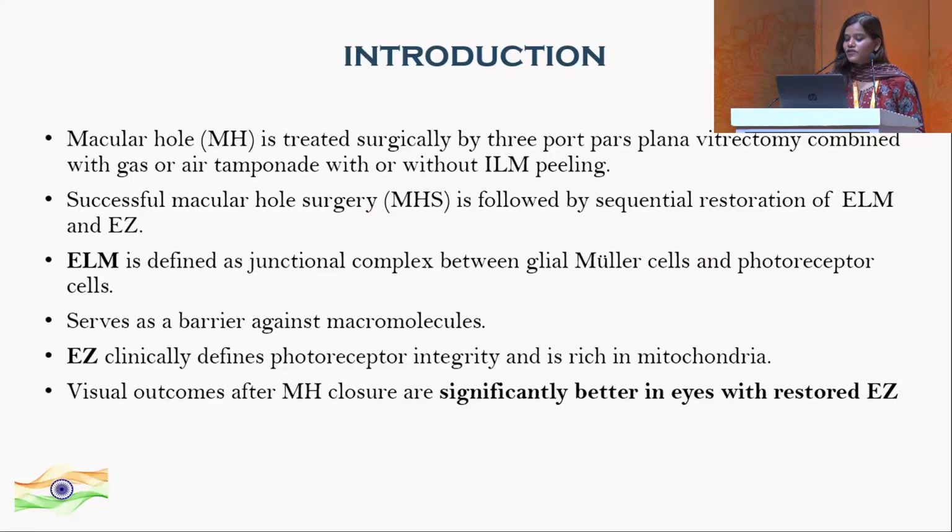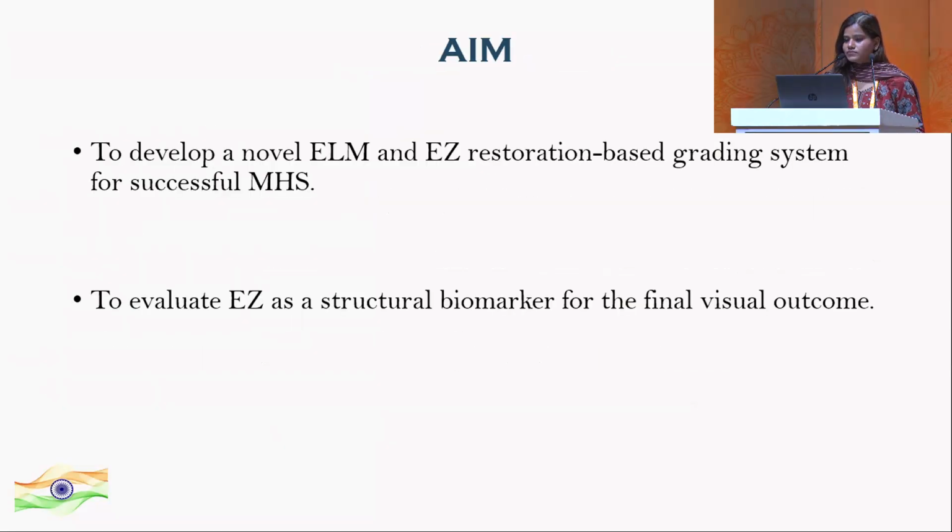The ELM is defined as the junctional complex between glial Muller cells and photoreceptor cells, which serves as a barrier against macromolecules. EZ clinically defines photoreceptor integrity and is rich in mitochondria. Visual outcome after macular hole closure is significantly better in eyes with restored EZ.